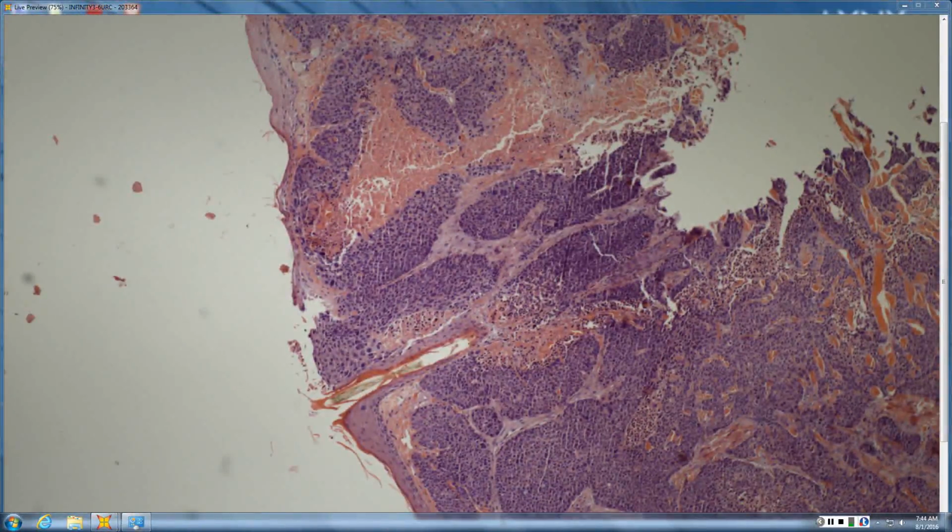So what appears to be coming off the epidermis might actually be latching on to the epidermis. It may be the other way around. And so this is a patient with metastatic lung that is epidermotropic. So epidermotropic metastatic carcinoma. You know, we can't assume that all squames are primary in skin.